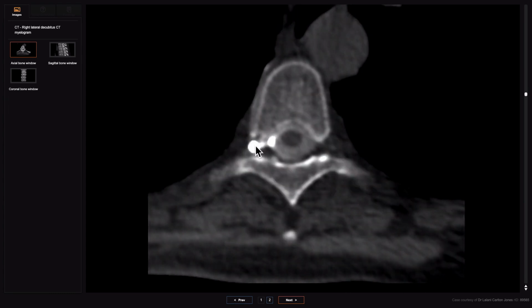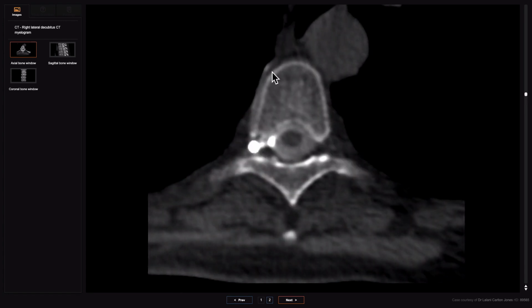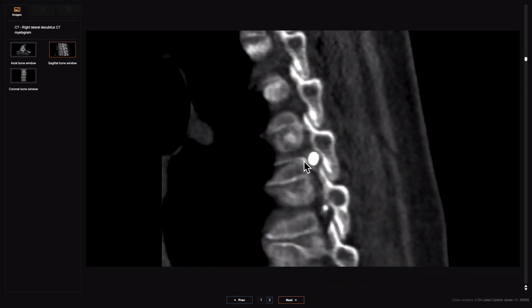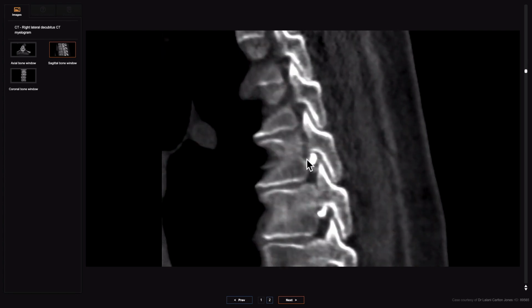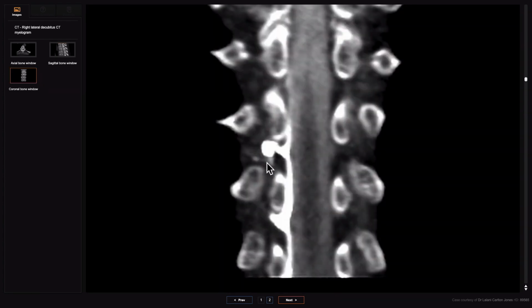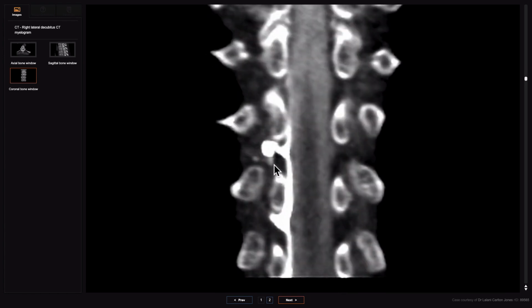And what we can also see is an anterior draining vein that is opacifying with contrast, passing anteriorly around the lateral aspect of that vertebral body and heading towards the azygos system. So this was a CSF venous fistula at the right T5 level. We can also clearly see that hyperdense paraspinal draining vein on those sagittal images coursing around that lateral aspect of the vertebral body, and on the coronal images you can see those abnormal little radicular veins, that venous meshwork around that diverticulum.